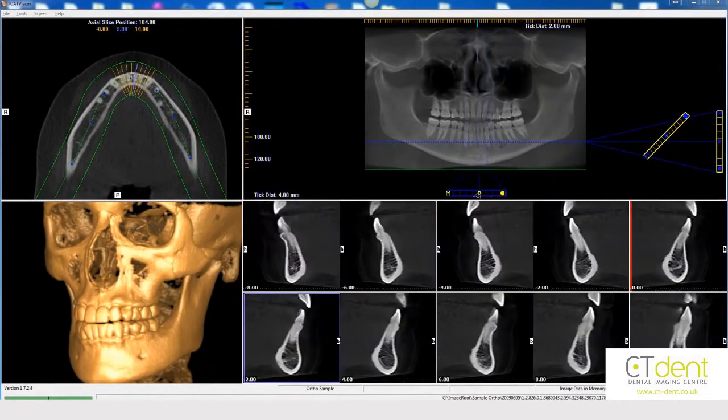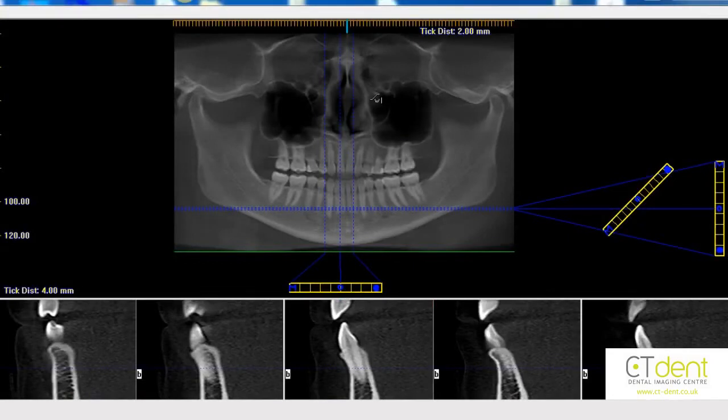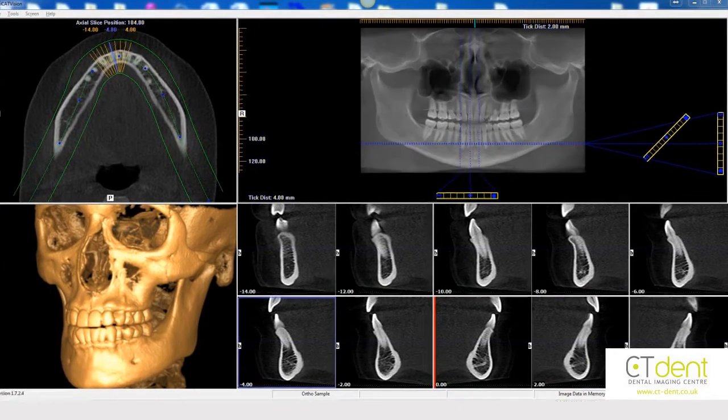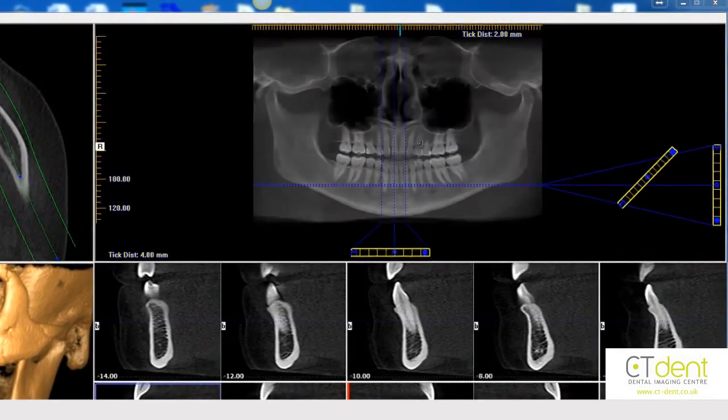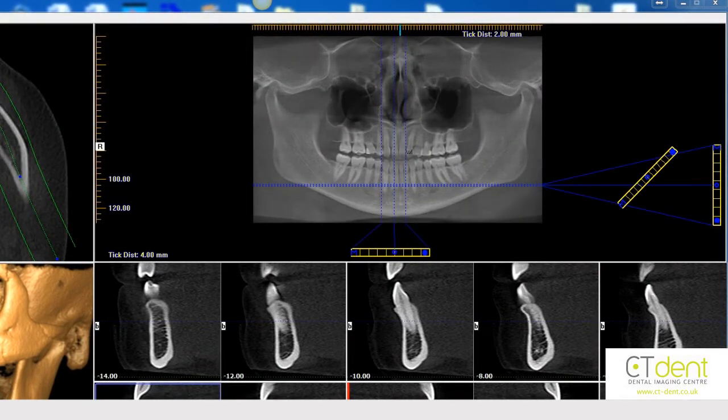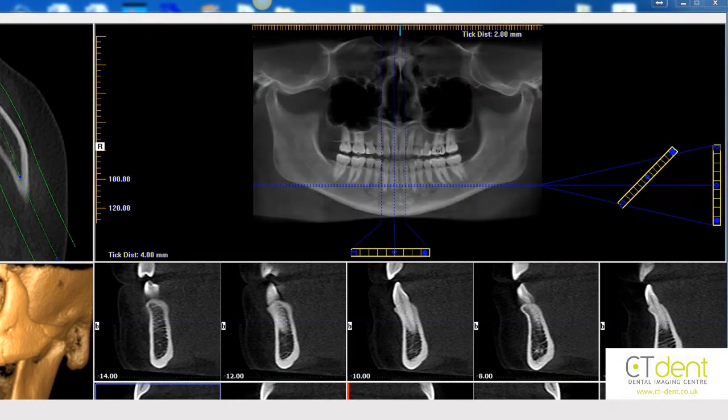The panoramic view, like the axial view, acts like a navigational map and can be used to identify and locate important reference structures. When moved over the image, the mouse cursor provides 3 functions. Moving the cursor to the central region shows up a W, which stands for window. Dragging the cursor in this location up, down, left and right will allow the brightness and contrast to be adjusted.